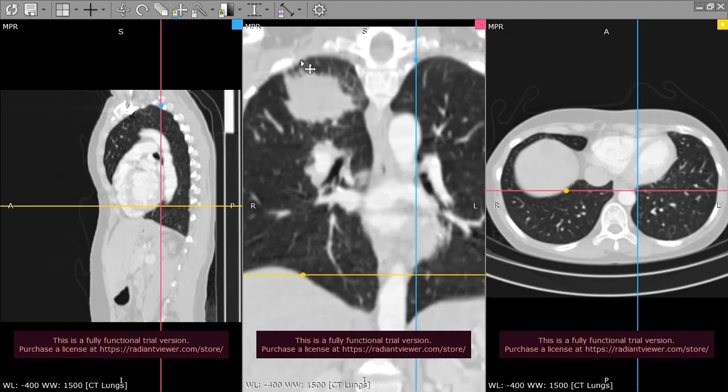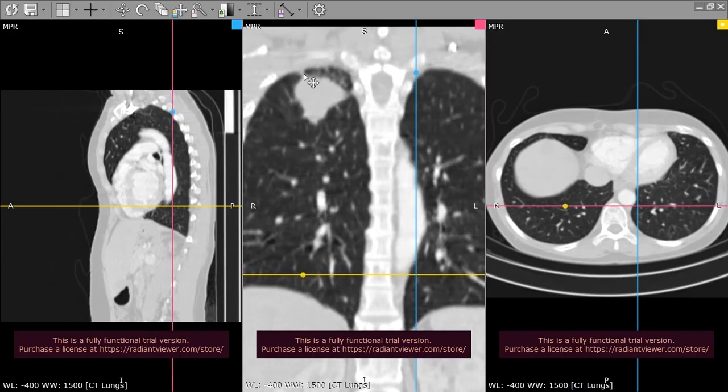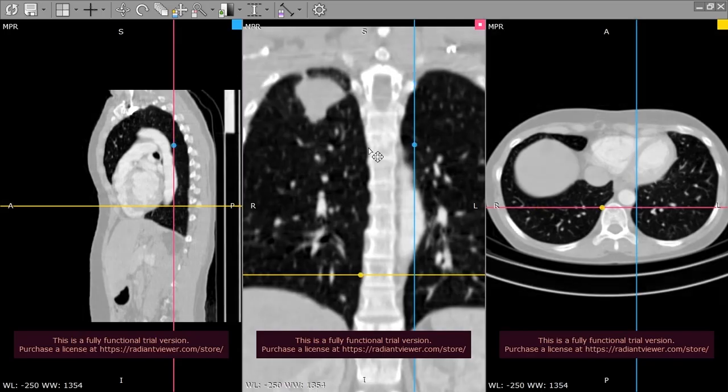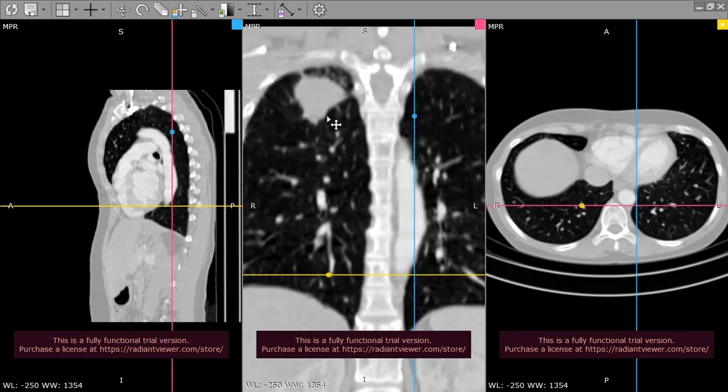It is a direct invasion of the lesion towards the nearby parenchyma and even reaching the pleural surface. This is what's called pleural tags or pleural tails. This is a site of continuation, a site of contact, between the lesion and the fissure. You can see it is bulging the fissure, even transfixing the fissure towards the apical segment of the right lower lobe, opposite to what we have seen before in chest infection, where it totally respects the fissure.